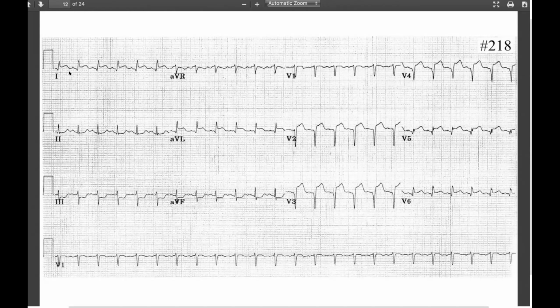First of all, before you jump to the ST elevation, there are two things. Is the QRS wide? No. Next one, pathological Q wave. So we have the pathological Q wave here in V2, V3, V4, V5, and possibly in V6, we do have a quarter of the R. And possibly in lead number 1, well, it's not too much. And now you can jump to the ST elevation.